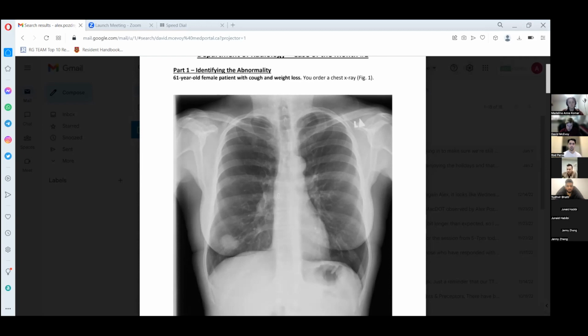And we also have our hila here bilaterally with lots of pulmonary vessels. So the pulmonary arteries are facing us. That's why you see a lot of haziness here, and that's normal. So oftentimes when I was just starting out, the primary abnormality I would overcall a lot of times was thinking that there's a lot of hilar lymphadenopathy or something, but oftentimes this is just very prominent vessels, which are totally normal.